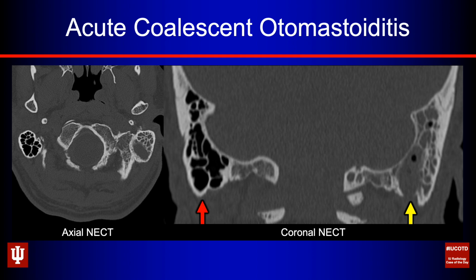You can see that nice, sharp, crisp cortex at the bottom of the mastoid tip. So as you can imagine, this would be a high risk for the infection to pus out going south along what attaches there? The sternocleidomastoid muscle. We'll talk more about Bezold abscesses in a minute, but this is a manner in which they can form when you have that dehiscence of the cortex of the mastoid tip.